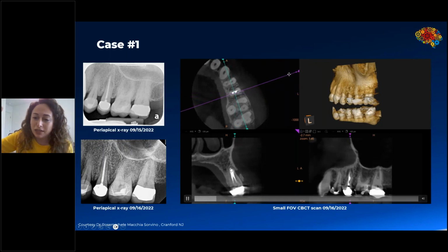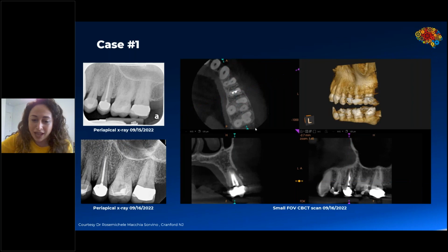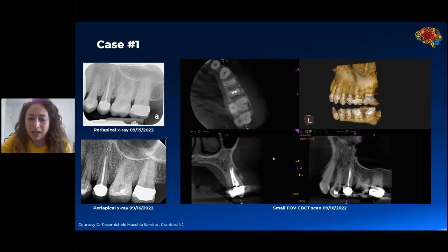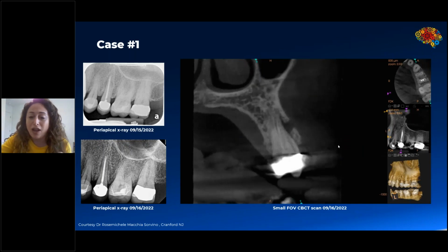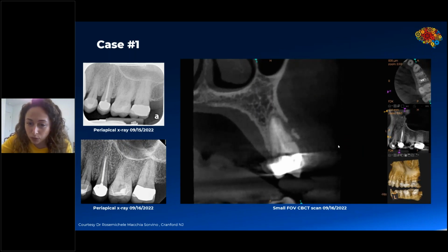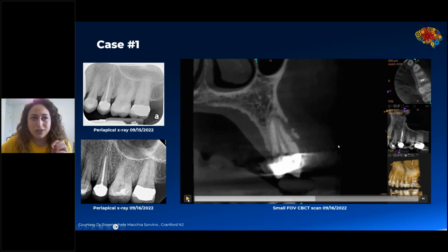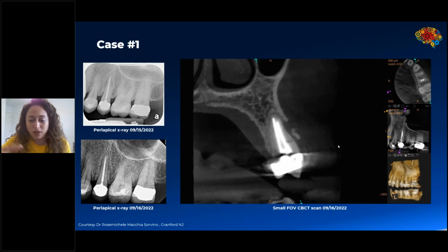The first thing we're going to do is align our movement handles on that premolar. We did that on axial view, now on coronal view, and then on sagittal view. As we're aligning them, we have a much clearer view of that specific tooth. Let me rewind for just a tiny bit. We maximized one view because it's easier to focus attention on just one tooth without jumping from one view to another.